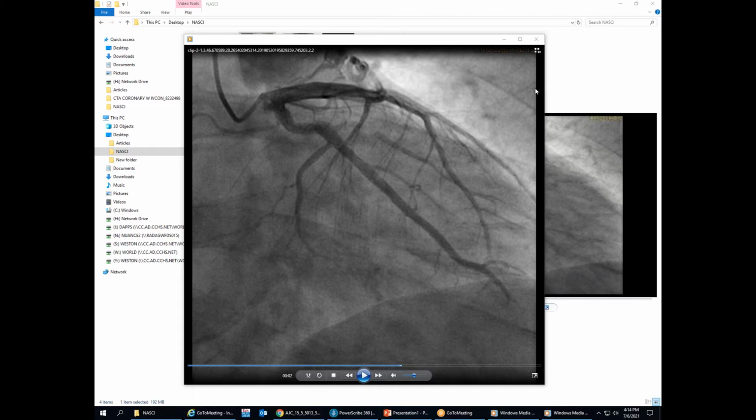Now, we do the measurements, and we are close, but we are not really at the cutoff, okay? We are missing a few millimeters to really reach the cutoff. And this is not the first case I see where the anatomy is very much suggesting on CT non-compaction syndrome, but we don't make the cut. So my question to the group is, do you guys see it often on CT? And what do you do with those cases where the clinical presentation and the appearance are very much in favor of that syndrome, but we don't really make it based on our millimetric measurements? So that's my case, virtually presented, and my question.